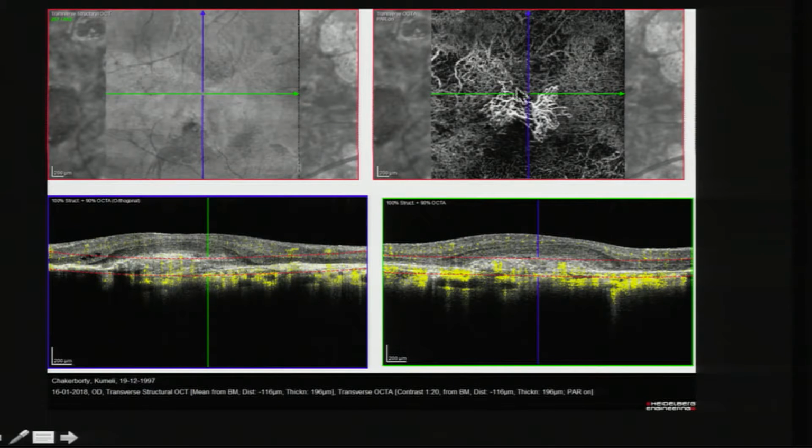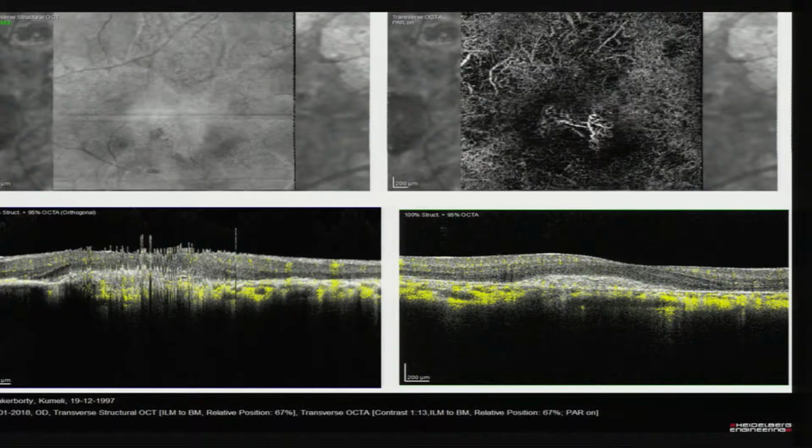This is the Angio OCT, which shows a beautiful neovascular network, which you are, without any doubt, sure that it is a choroidal neovascular membrane, which is growing under the scar. So this is the patient who requires anti-VEGF injection. This is again to show the neovascular net on angio OCT. This patient receives injection, and this is post-injection showing some regression of the net.